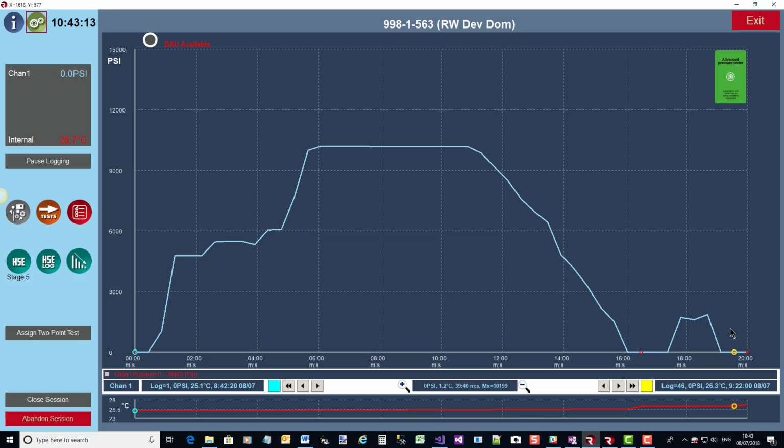It takes us to a convenient time period, but we can see that there is a new point being given. It's now gone up to 47 from 46, and that tells us when logging was restarted. So these red marks are really to tell us when logging was started or restarted. In this case, restarted at the beginning here when it was first started.